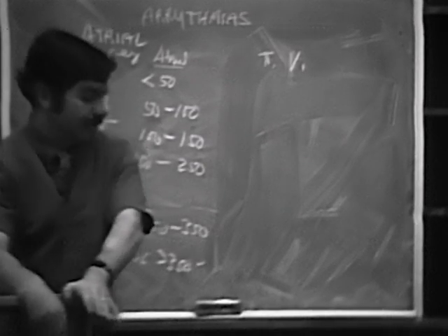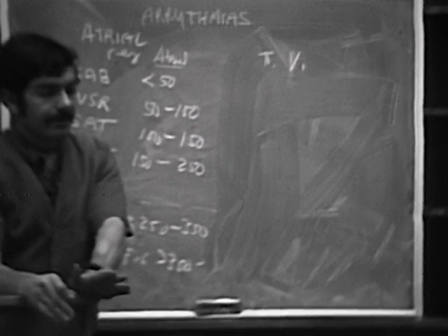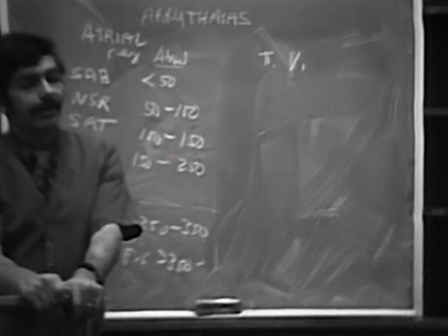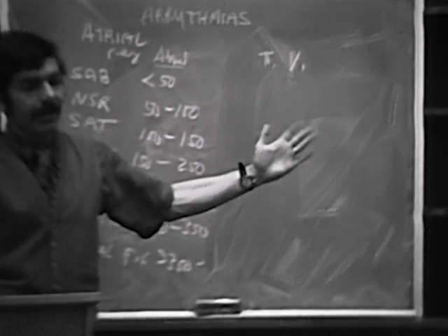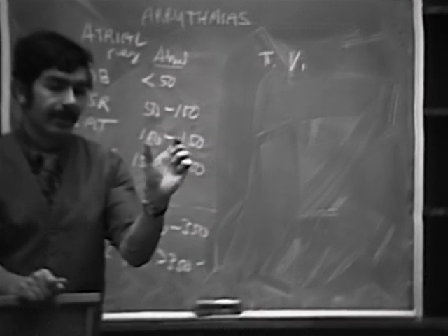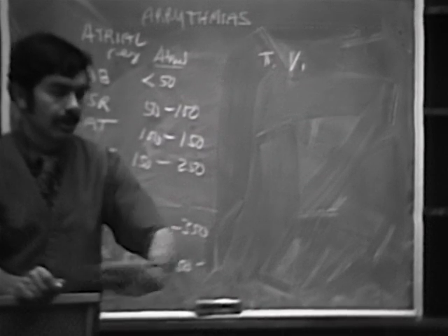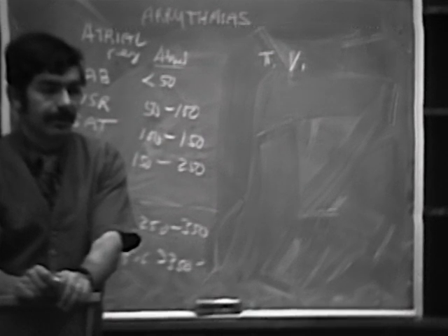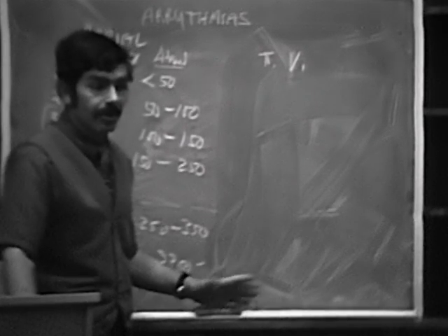But let me just point out something that we always have trouble with. And that is that anytime you're trying to evaluate an arrhythmia, you should take an entire electrocardiogram, because so often we see that long a strip of lead 2 with no information on it, and then we'll get lead V5 which has 3 beats on it with beautiful P waves. So it's really worthwhile just to look through an entire tracing before you take your long rhythm strip, when you're trying to evaluate the arrhythmia. Right? It's just common sense. But very often we'll see it in a lead that you don't expect to see it in.